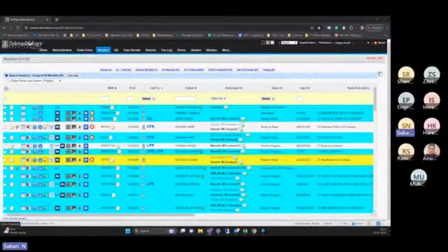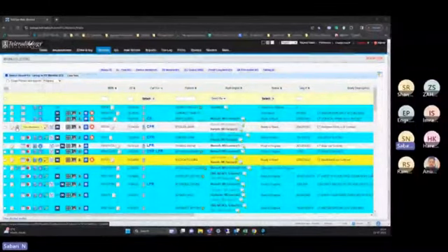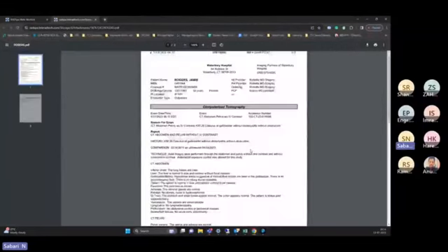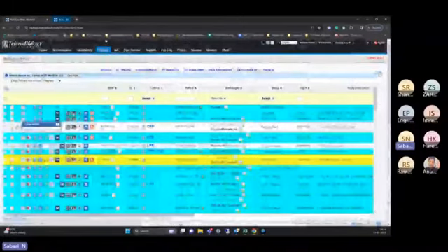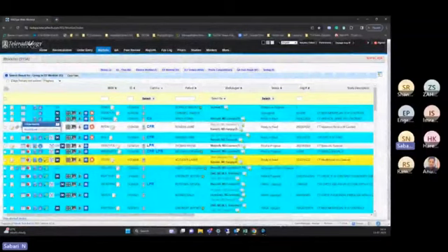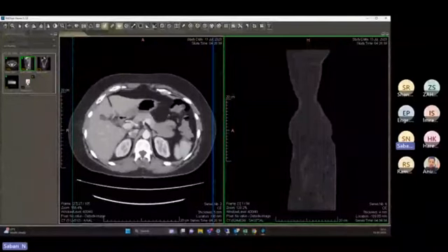But as a radiologist, when I'm viewing the images and want to see the history of this patient, I don't want to come and click the attachment here. That is an additional task for them. So in our application, the advantage is that if you open the viewer, the PDF also comes in automatically, whether it is a PDF, JPEG, or PNG, any format. It opens in the viewer only. This is the advanced feature we are giving. When I double click on the viewer, the PDF opens here automatically.